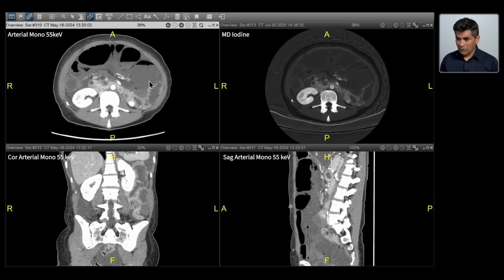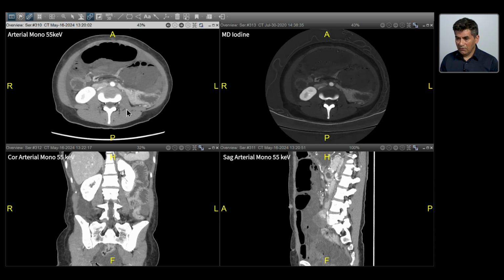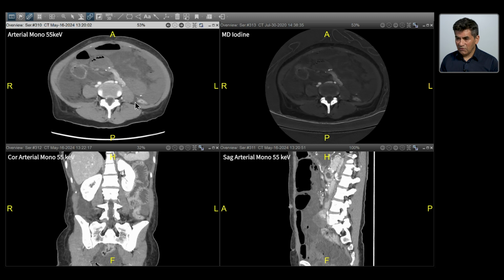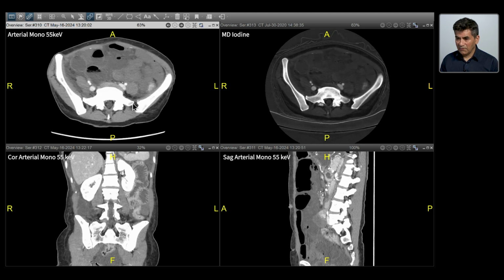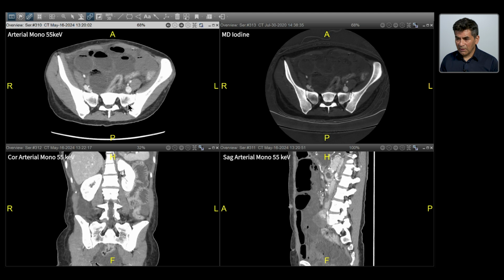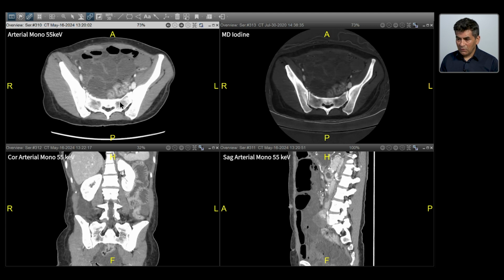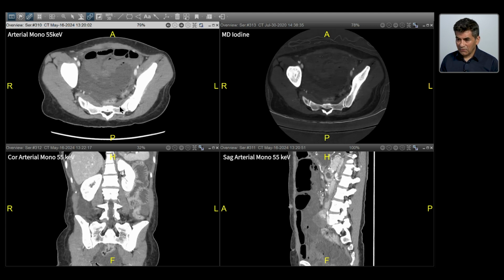One distinction you will notice between the bowel that is extremely distended versus the bowel that is not distended is less enhancement, relatively speaking, and I will come to that finding again. We go down and we look at the same distended bowel, some bowel which is showing enhancement. There is not much enhancement in this part of the bowel. As we go down, we look at is there any transition point, and I will evaluate that further with the coronal and sagittal images. We notice this bowel is completely collapsed here.